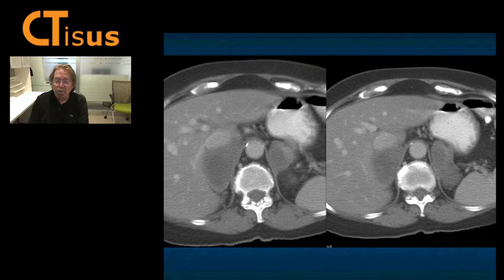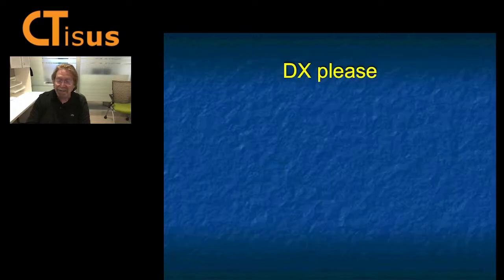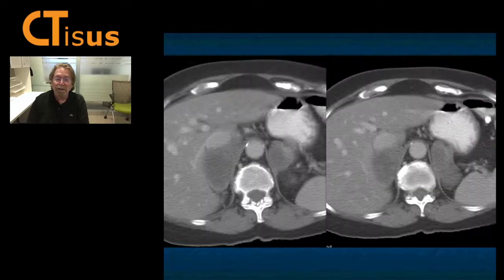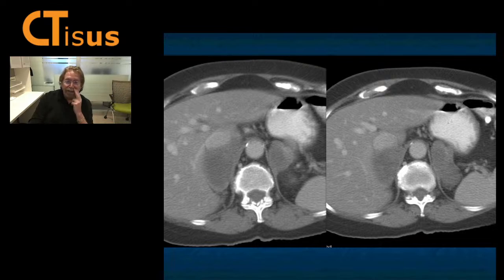You've got to also remember, and I did not say it, but I knew the answer, what about lymphoma? Lymphoma, typically bilateral, typically bulky. This is actually small for lymphoma. Primary lymphoma is when there's involvement of the adrenals, but no extra-adrenal involvement. You can see we don't see adenopathy, we don't see anything else. Nice soft tissue infiltration. Very nice example when you look at those images of lymphoma. Again, I've had a few cases recently, but they're big and bulky, not looking like this.